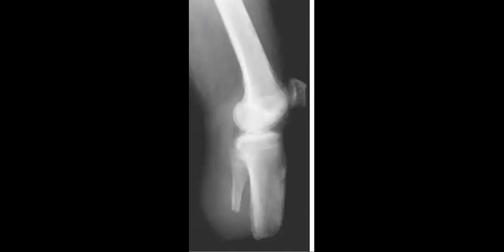Marwa, bony lesion. So where is the bony lesion exactly? Permeative moth-eaten bony lesion. Try to characterize the location. I want a model answer. It's good that you made a good start. Very nice start, by the way. So permeative, yes.